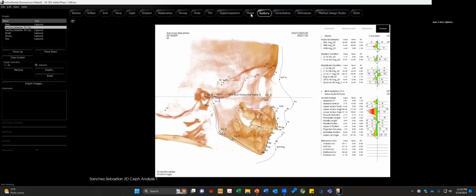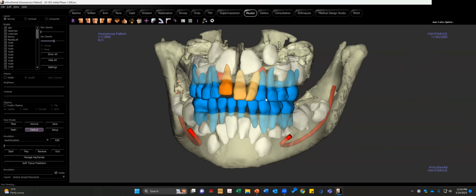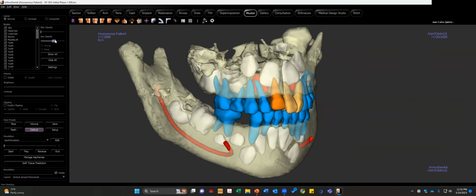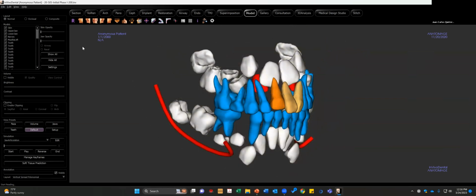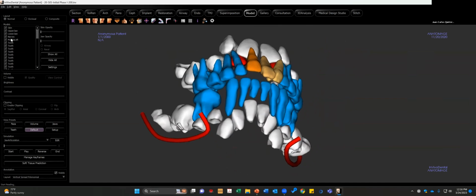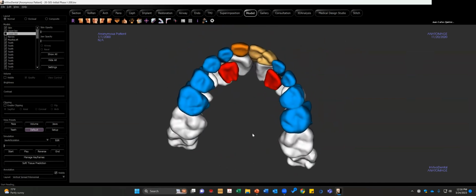So in particular, like for my cases, they know to color primary teeth a certain way. You can see here, you're wondering way in the back, okay, why that tooth is red. Well, clearly that's just removed. So you can see how I'm interacting with the data, right? And dissecting essentially the patient.